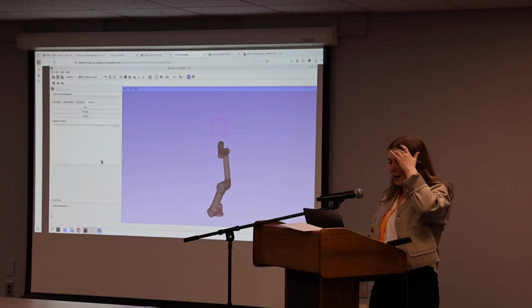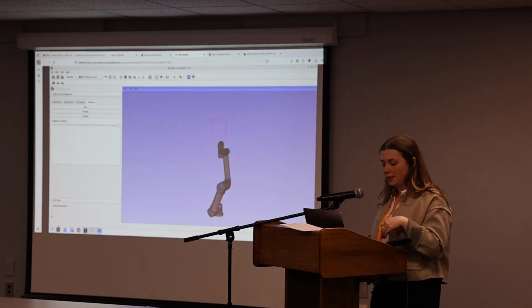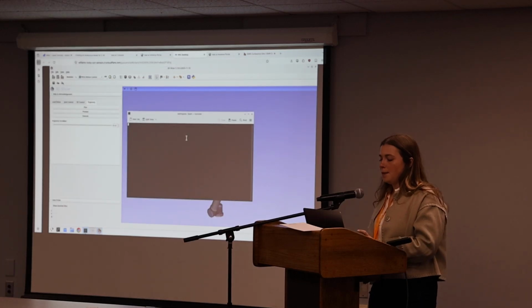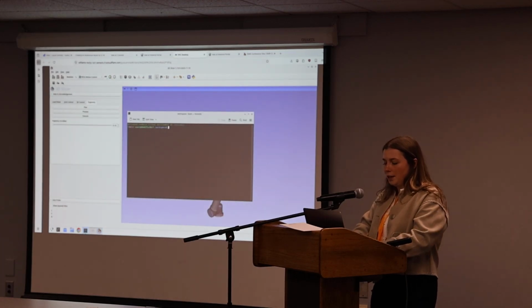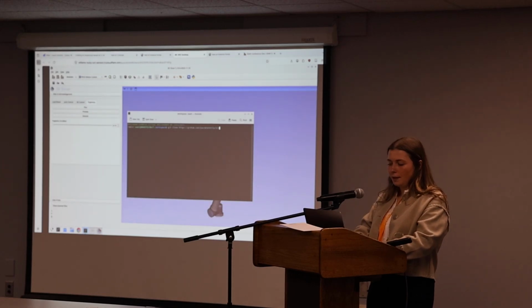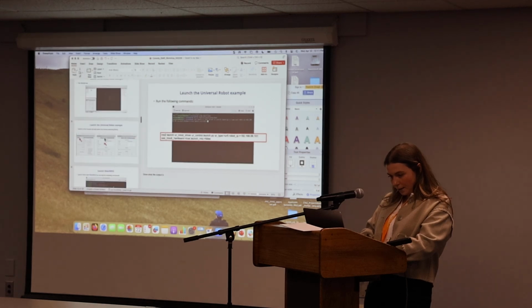So the next part, I'm going to have you add a custom end effector and then a model into the scene. You just want to open up another tab, and we're going to clone a repository, which is github.com, my name, and then I think it's SlicerROS2_tutorial.kit. Let me just quickly check.